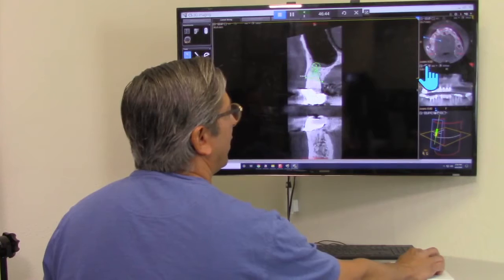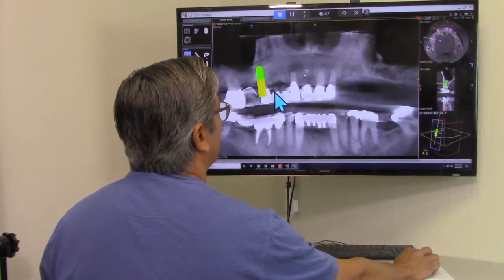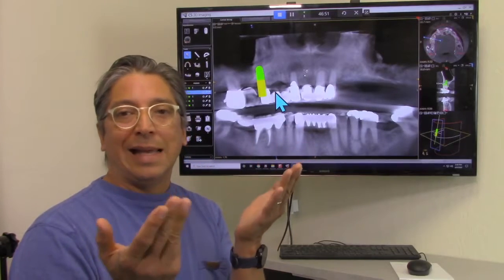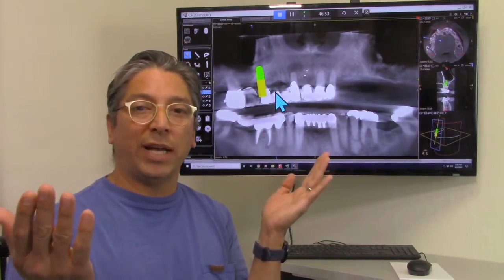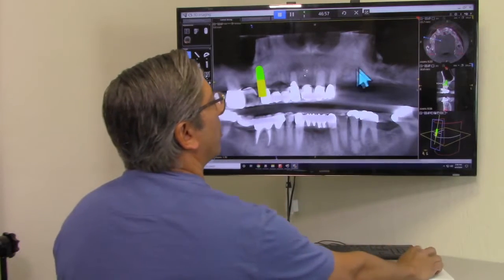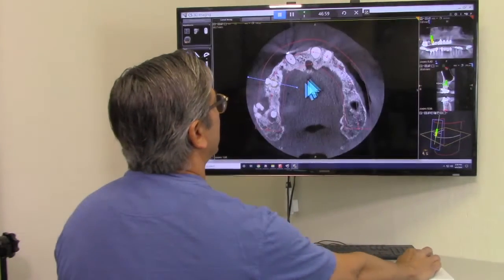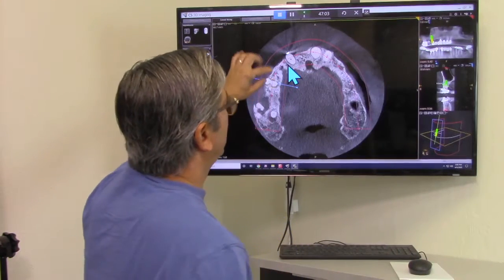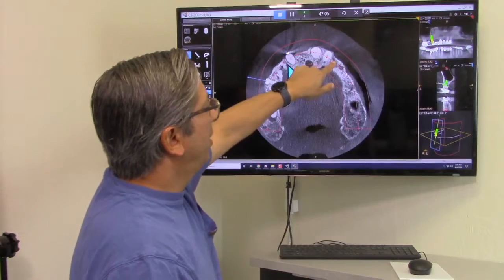The next area that we're looking at is right next door, but we don't want implants right next door because it doesn't really add any value for a large case. The value of implants across the entire arch when we're looking at the arch form like this, we want the implant here, like a four-legged stool. We want something here, here, here, and then here.